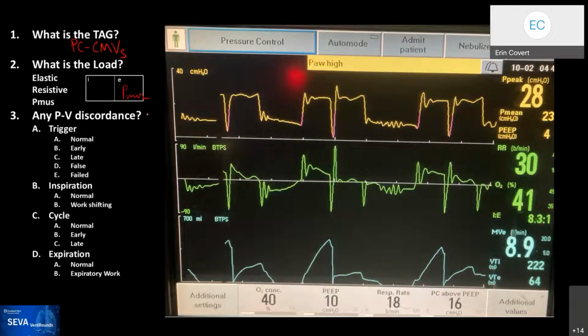For the trigger, I'm looking at that early drop in flow and then coming back up quick. Obviously the patient is double triggering, but it seems like an early trigger. Those all look like patient-driven breaths. And when I'm looking at expiration, it doesn't seem like it's cycling off early. So the cycle is okay and it's more an issue with the trigger, but I'm not entirely sure.